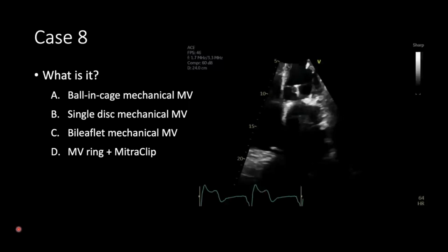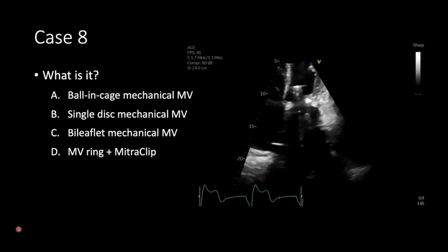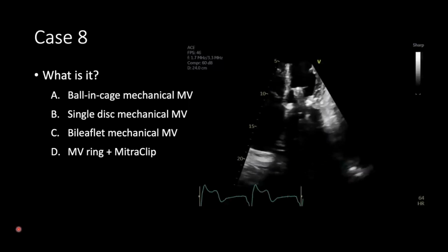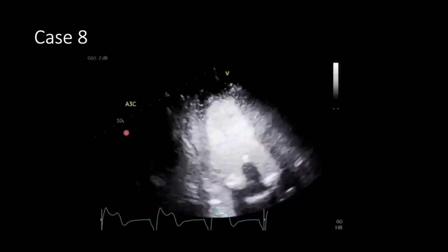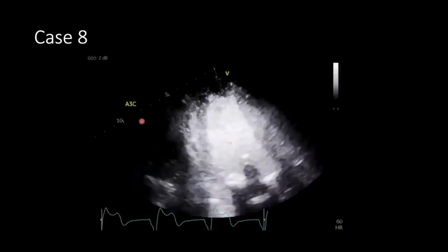There are no more views. Yeah, Grace, that's the real answer. You would obviously have many views. So kind of an even split, maybe D, maybe A. So this patient gets contrast, which is always helpful in this sort of scenario.